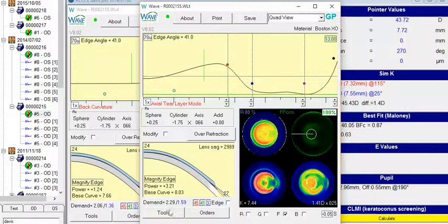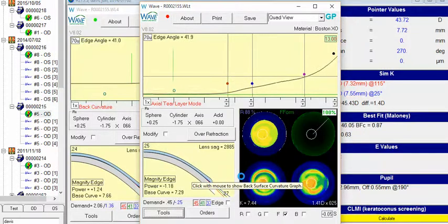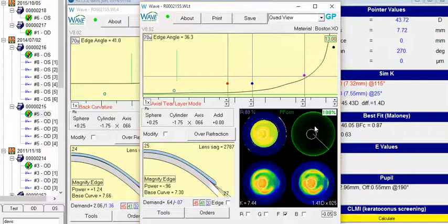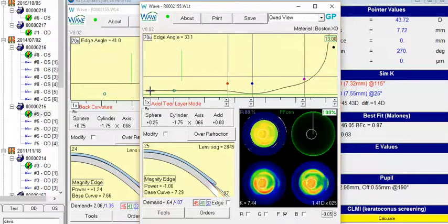Yeah, close enough. And then went to Tools, Current Settings, and I'll let Wave do a little designing here for a moment. And now that we have that, I went and increased the central clearance here by clicking down in the blue in the 100th percentile. By doing that, I want to get this up around between 10 and 15. Central clearance, we're at 4 to 5 right there. Let's go a little more.